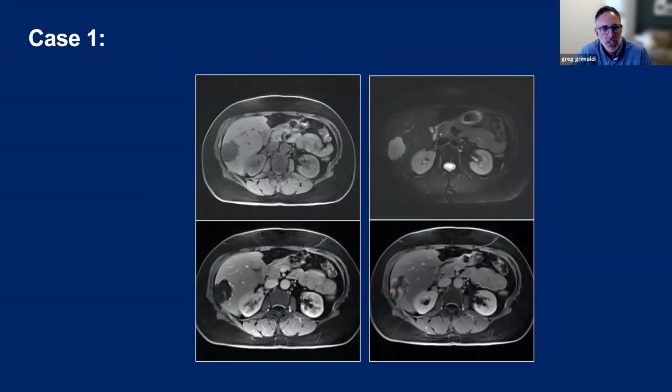So I have about 5 or 6 cases here that we're going to go through. I'm just going to take them like I'm a radiology resident sitting in the reading room, so hopefully you'll get the experience. So these are 4 images through the liver.